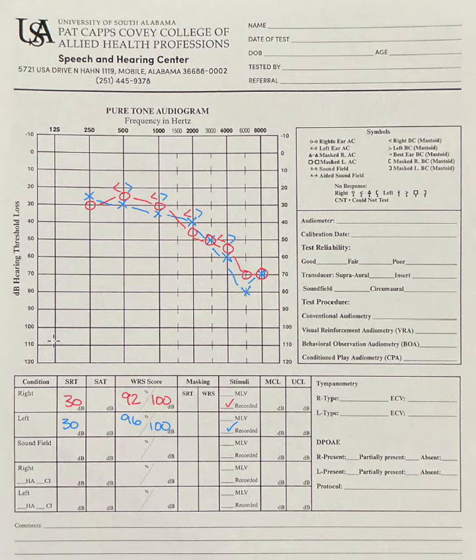Now, when we're looking at how much hearing loss you have, anything above this 25 decibels, this 25 range here and above is normal. And so what I'll do for the patients, I'll flip the bottom of the page up and kind of draw a line there so they can see what is in the normal range. And then I'll remove that and unfold it back down and say, and everything below this is showing hearing loss.